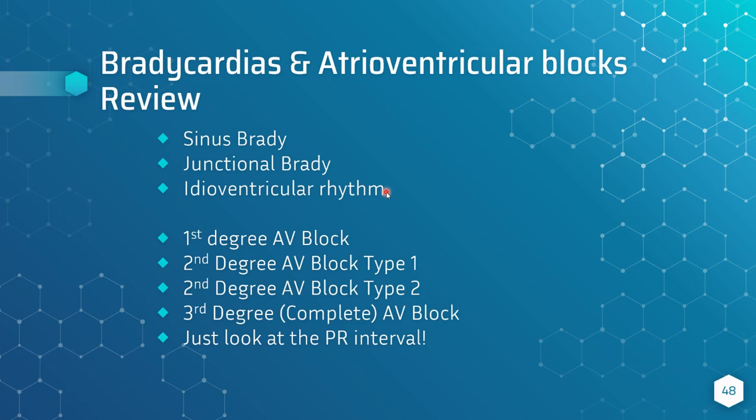The reperfusion puts you into that rhythm. Patient usually has no symptoms and is just sitting there with nothing going on, living their life, and they'll go out of that rhythm eventually.